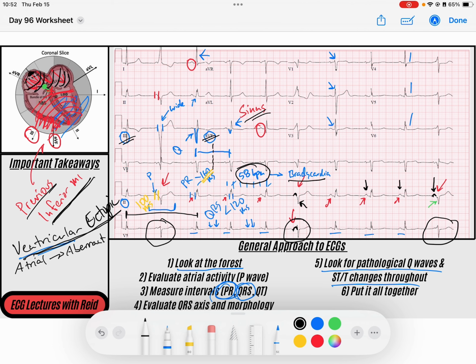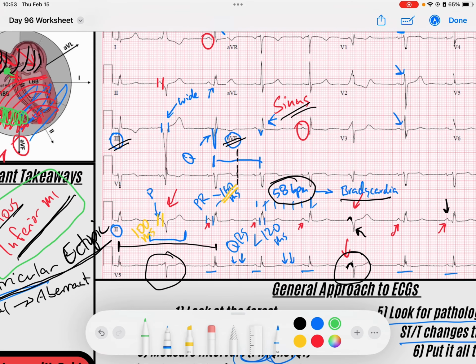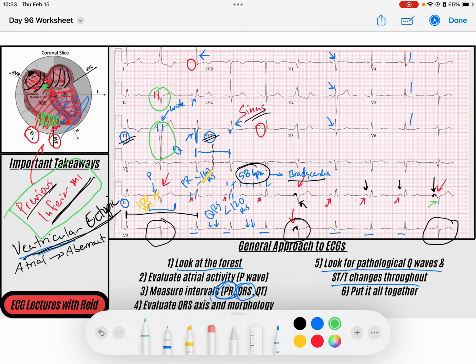And so if these ventricular ectopic beats were concerning in any way, if this person was having episodes of ventricular tachycardia, you could be concerned, right? Think of, we've got this previous inferior myocardial infarction that we said occurred somewhere maybe here. And if you look at this PVC, it's got negative forces in the inferior leads, right? Lead 3 and lead 2, it's negative. So these PVCs, or these ventricular ectopic beats, are going away from these leads. So that means that it's traveling up from the inferior portion.